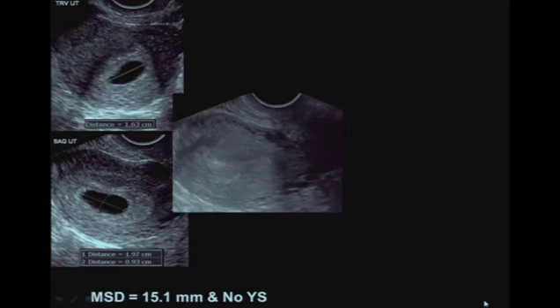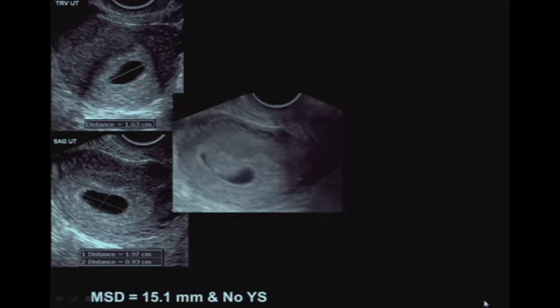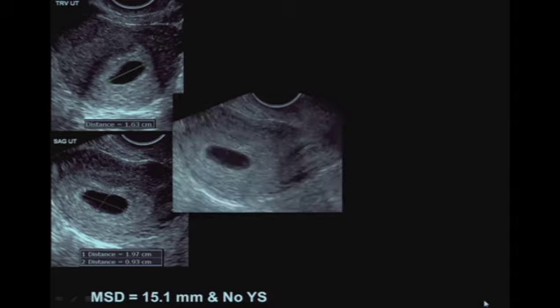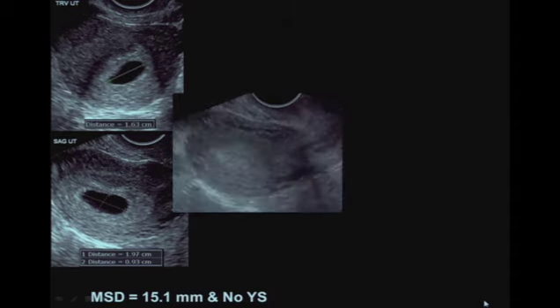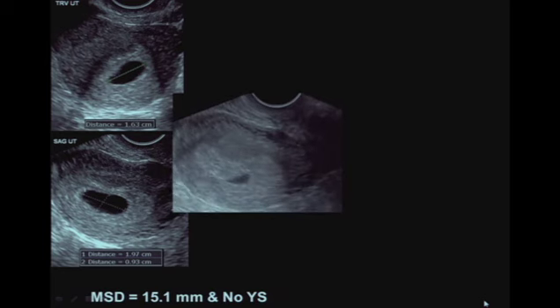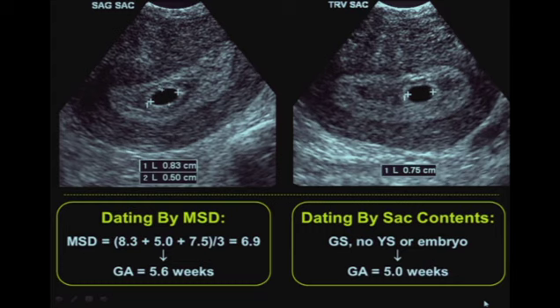This is a case of a mean sac diameter of 15 millimeters and no yolk sac. At one point, it was thought that this was a reliable criterion to diagnose pregnancy failure. But we now know that it isn't. Here's an example where it's 15 millimeters and no yolk sac, and a week later there's an embryo with a heartbeat. So the mean sac diameter without a yolk sac is not really reliable.